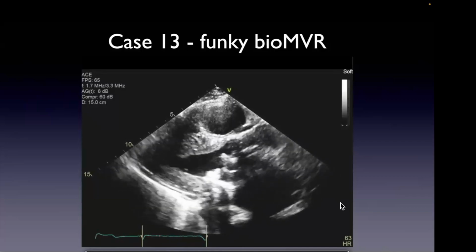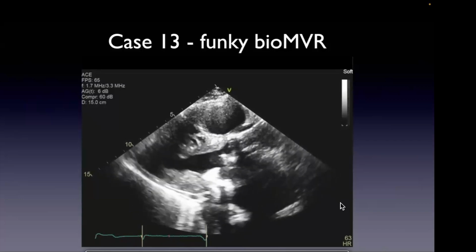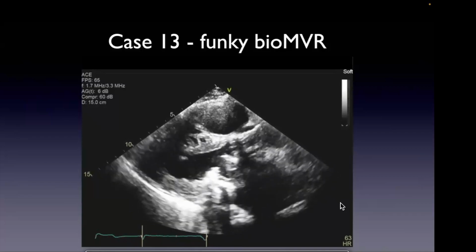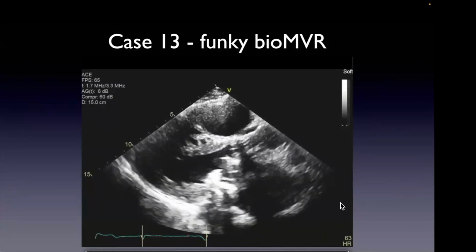The other view, this is a bit of an optical illusion, a kind of neat optical illusion, actually. So I think part of it is that the valve in valve is a little bit more atrial, so you don't necessarily see the base of the leaflets on it. Yeah, they're shallow. So it is weird, but it creates a bit of angst when you look at it.